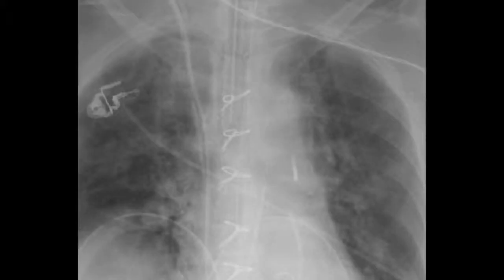The tip of the intra-aortic balloon pump is usually radio-opaque. It should sit just distally to the left subclavian artery origin, which is at the termination of the arch of the aorta. On a chest X-ray, this correlates with the second intercostal space on the left.